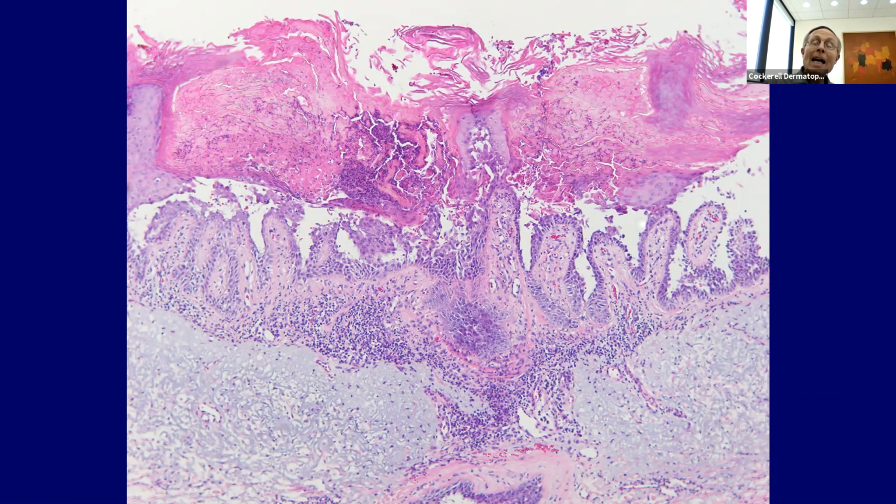Now to look at acantholysis, we ask ourselves, is there anything about that that's helpful to us? What can we do to be more specific with acantholysis? So is there acantholysis plus dyskeratosis, which is seen more commonly in things like Darier's disease and Hailey-Hailey disease sometimes, and then Grover's disease, those conditions that give you the acantholytic dyskeratosis.